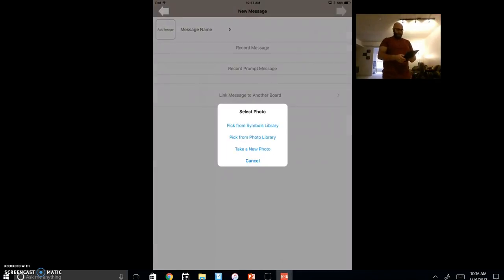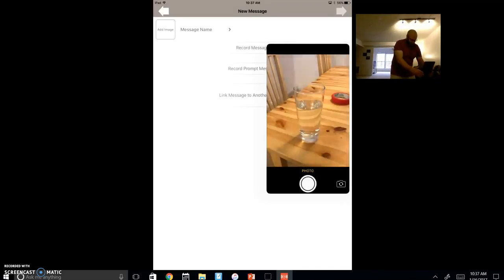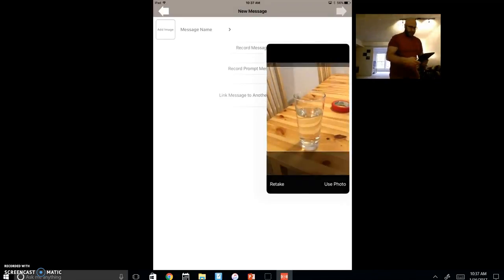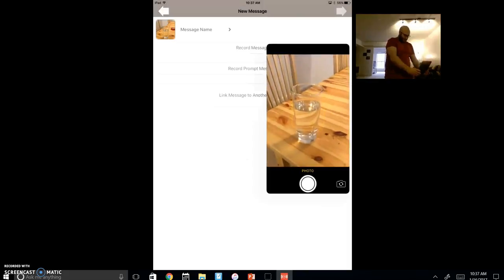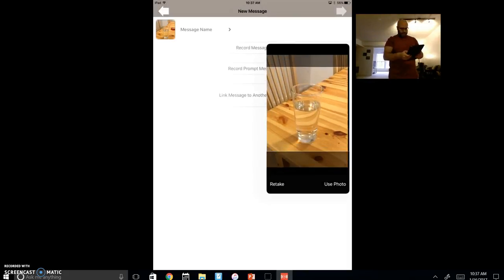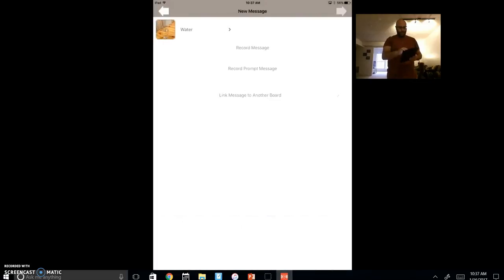So I'm going to start with the water. We get that tape out of the way. Retake the picture. So for the message, I'm just going to type water. But when I record it, what I'm going to do is click. I am thirsty. Could I get a drink of water?